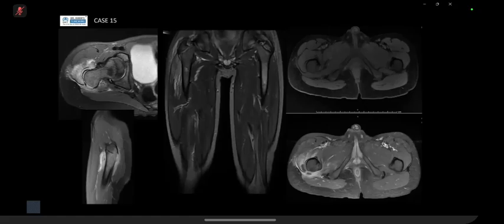Okay, so quick question. If I didn't tell you the inflammatory markers, without the inflammatory markers, what would you have thought it was? An aggressive lesion, since there is edema and the cortex is breached, and there is an enhancing collection. So I'll go with osteomyelitis or Ewing sarcoma, an aggressive lesion rather than just a simple benign lesion.